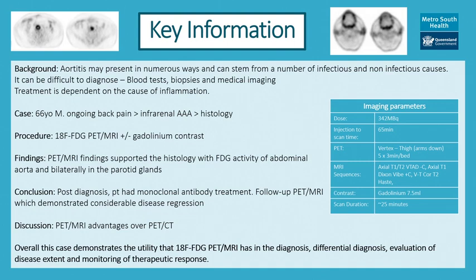PET MRI also has the advantage of a lower radiation dose than PET CT, which is particularly beneficial when follow-up and therapy monitoring is required. Overall, this case demonstrates the utility that 18F-FDG PET MRI has in the diagnosis, differential diagnosis, evaluation of disease extent, and monitoring of therapeutic response for patients with aortitis.